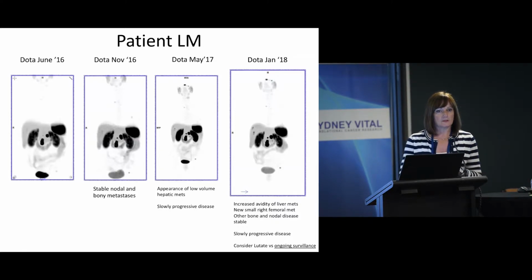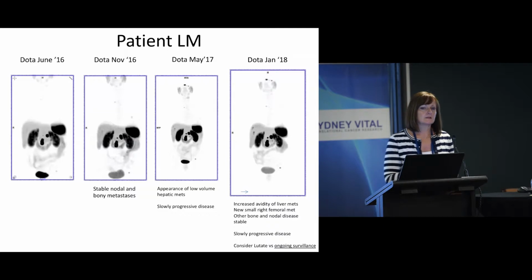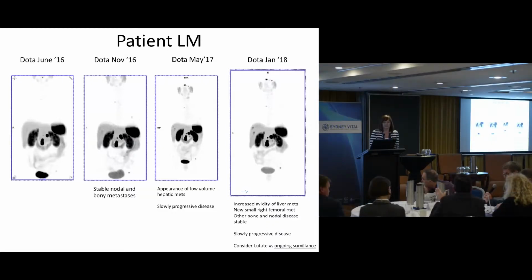Yeah, probably a good opportunity to ask a question here. Shell, we're only presenting nuclear imaging, but sometimes these patients will have had an interval CT along the way. I don't think the liver mets were visible on CT imaging in this lady, so we've learned things we wouldn't have otherwise known. So the question is, should that be impetus to recommend therapy in this case?